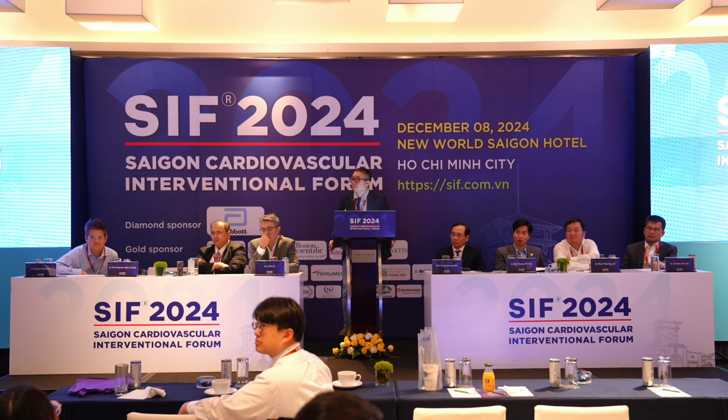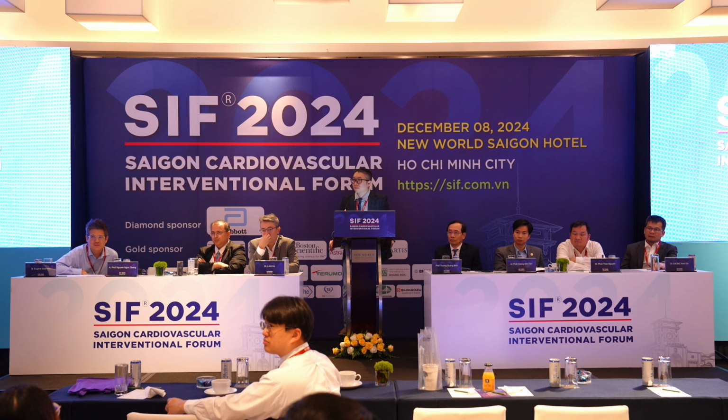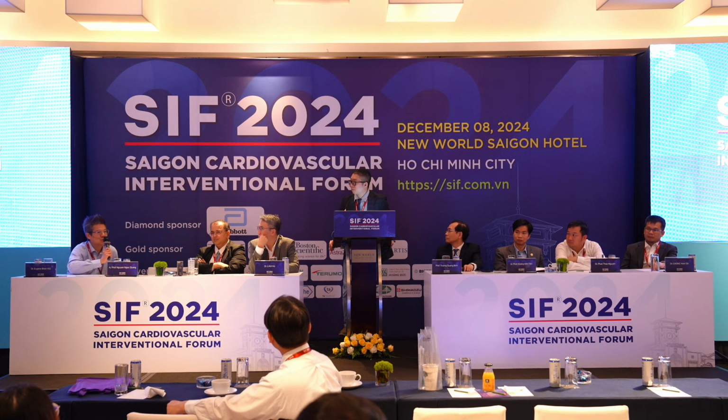It's a miracle that he survived. It's quite an interesting case. So finally, the final outcome is good, and it's a kind of ADR, involuntary ADR, something like that. You agree? So yeah, absolutely.